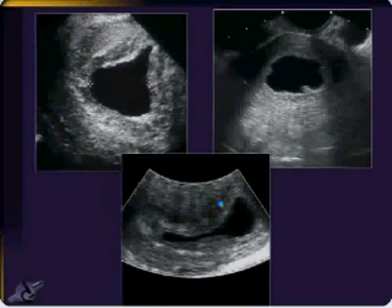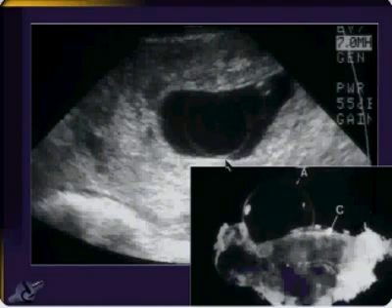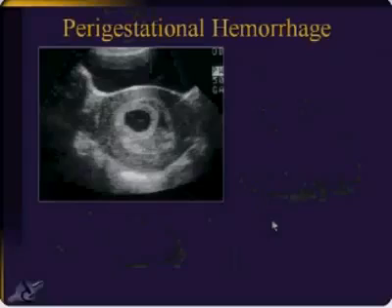So, here are just 3 different anembryonic pregnancies, irregular sacs, all of them. Some other thing you might see is the empty amnion. See the chorionic cavity, the yolk sac, the empty amnion. Remember in our normal ones that the amnion really made a little bubble around the embryo in there. We would expect a large embryo in there for the size of that amnion. So just at first glance, you know that is an abnormal pregnancy. And there's just an empty amnion right there. And just 3 more examples of empty amnions and irregular sacs.